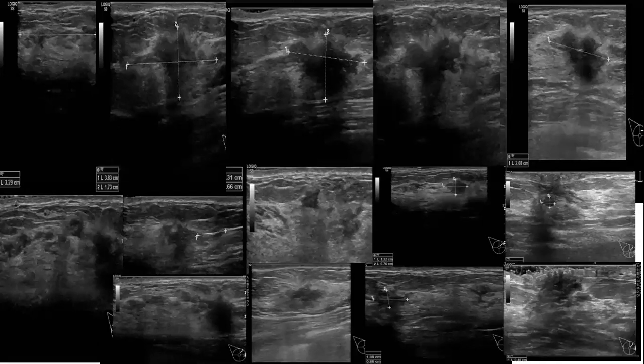Ultrasound demonstrates irregular, suspicious lesions with multi-directional ductal extension. So these are long spicules, not only thin spicules, some of which are ductal extensions, irregular ductal extension.